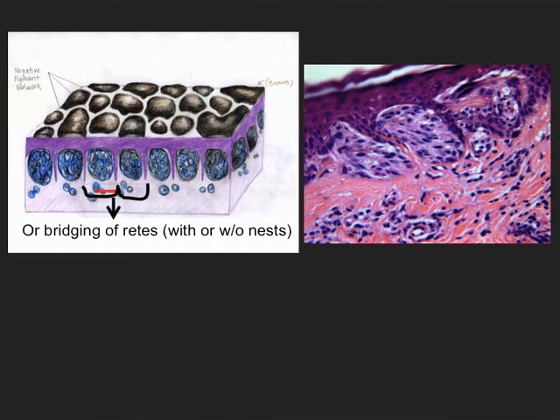And normal nevi, or a nevus, tends to create clusters and spheres, whereas in melanoma and in Spitz nevi, these clusters tend to be elongated and irregular, not as a sphere. And so you can already predict you're going to see it more in Spitz nevi and melanoma, the negative network.